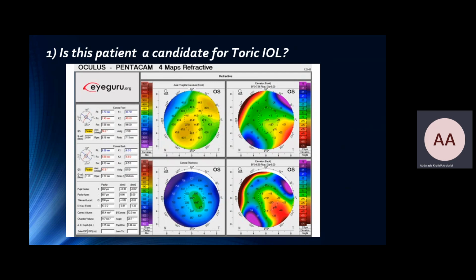Thank you. Yeah, for me, I agree with the doctor. If it's like this, you may undercorrect your astigmatism a little bit. This is one. And second, make sure the axis of the IOL master is similar to the axis of tomography. If they're off axis, that means there is dry eye or some corneal irregularity.